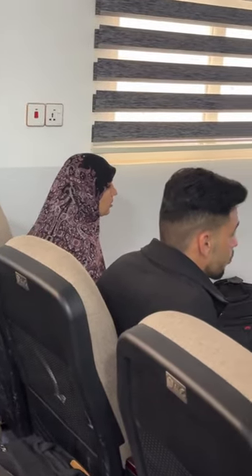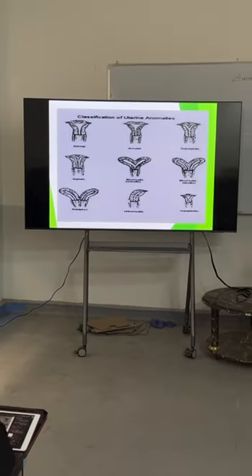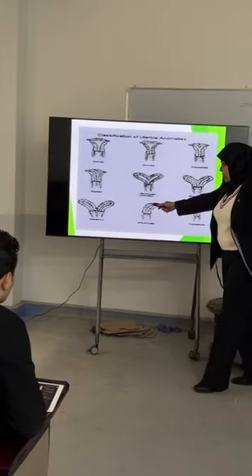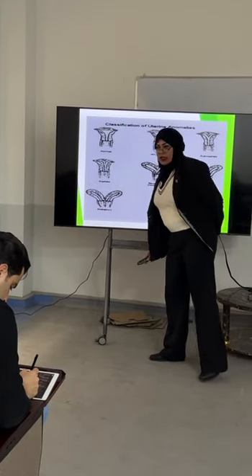Both of them contain two uterine bodies and two uterine cavities, but the bicornuate has a single intact cervix, while the didelphys contains two separated cervices.